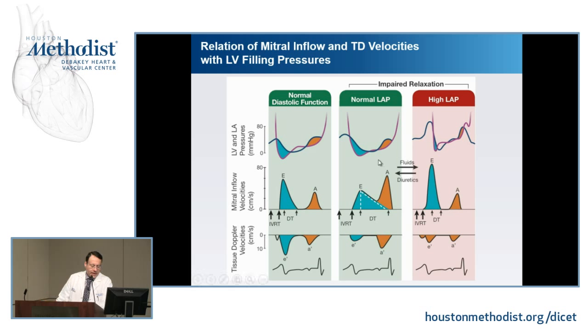Okay. Can we make inferences about filling pressures and how they change just based on mitral inflow? If I know whether the heart is normal or abnormal, I can. But if I do not know, I need something else to allow me to move from saying this is a normal or an abnormal heart.